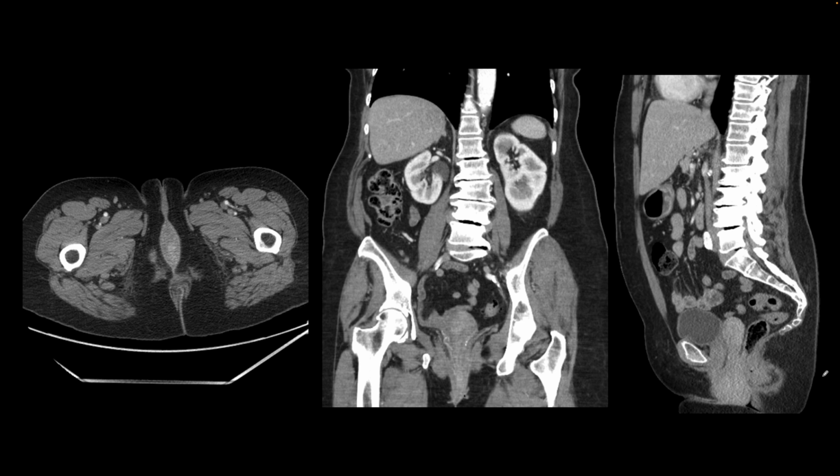Here is our next patient, and again, the abnormality was not very obvious on the axial images, which we typically read off. And so here, inferiorly in the pelvis, we should never see the vagina or abnormal soft tissue density. And again, on the coronal images also, it's not very clear, but on the sagittal image, we find that there is a prolapse right there, vaginal prolapse. The uterus has descended also. And here's the urinary bladder and the rectum, which look normal.